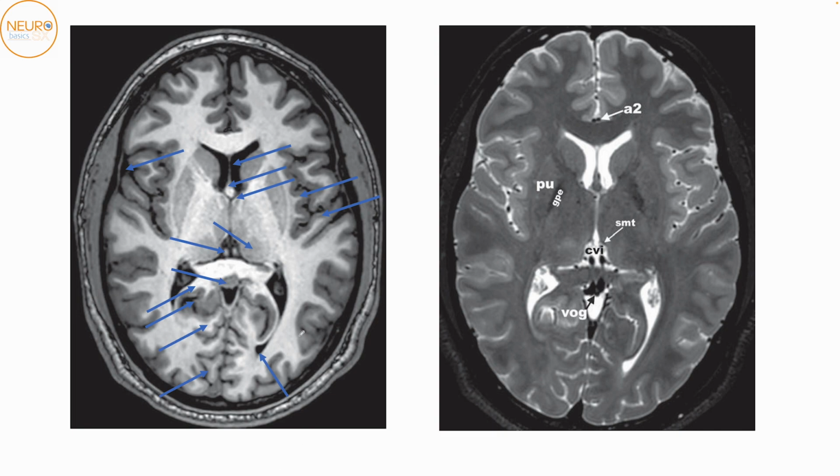Okay. So when we come lower down, we have the same very obvious thing. You have the Sylvian fissure over here. You have the insular cortex. You have the above the Sylvian fissure. This is all frontal lobe, and this is all temporal lobe. This very obvious gyrus which is standing out, this is the Heschl's gyrus. This is part of the temporal lobe.